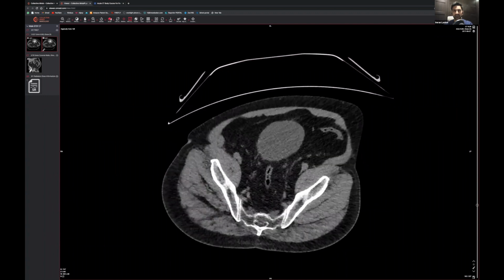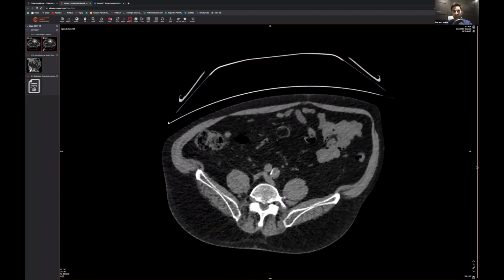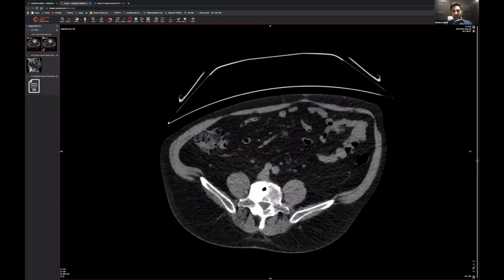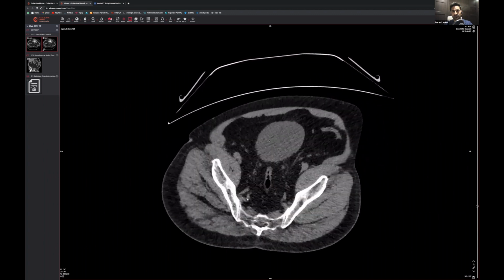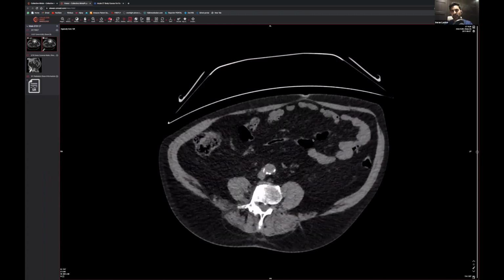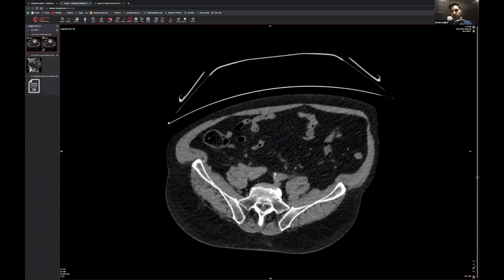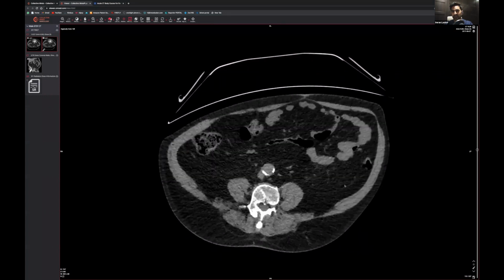We haven't seen any inflamed sigmoid colon, but the sigmoid colon does go quite far up, doesn't it? Coming up this way, and I don't know, has someone noticed it yet? Someone may have noticed, but I just want to make sure we're good at following the bowel. Going along like this, that's still sigmoid colon, veering off all over the place, going this way. Then we're coming up to the descending colon. It all looks okay so far.